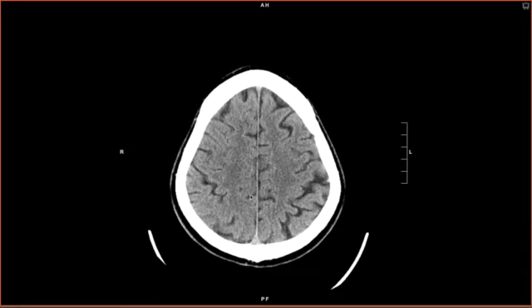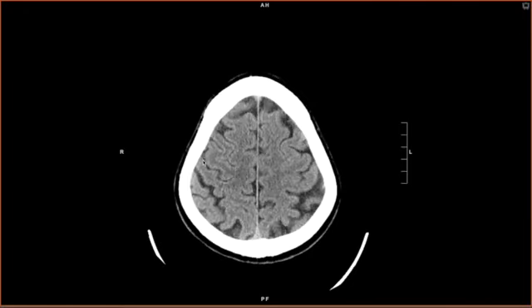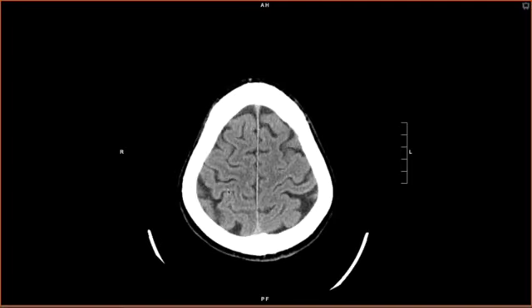Another way to find the central sulcus that's practical is looking for this in the midline just inferiorly. Call it mustache sign. It kind of looks like a mustache. These are the marginal sulci. If I scroll up, the sulcus anteriorly to that is going to be the central sulcus, and it is here as well. If you aren't going into radiology, don't worry too much about these details. Just know the basic lobes for now.